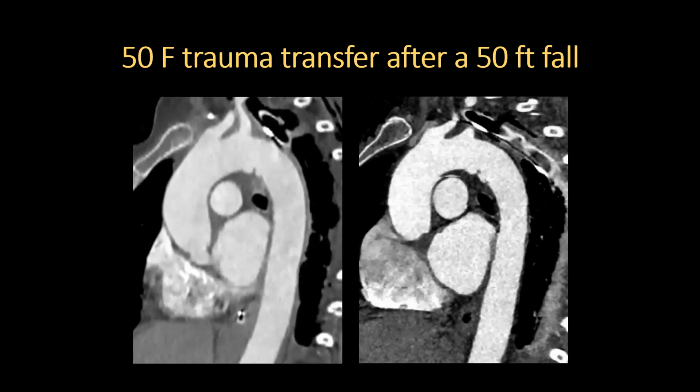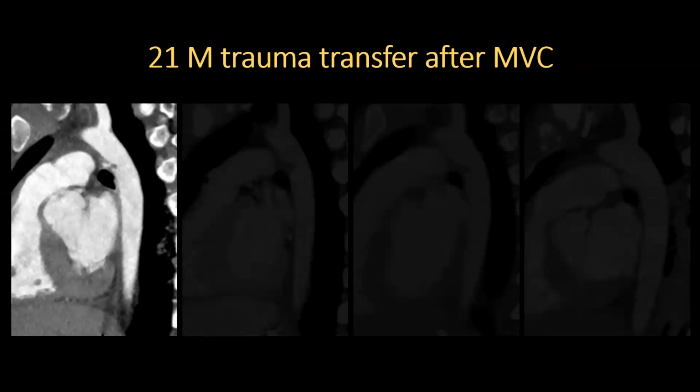The patient went on to get a follow-up CTA a few days later that showed the two bulges persisted and slightly increased in size. She went on to endovascular repair. The guidelines do not distinguish between small and large pseudoaneurysm treatment recommendations, although an emerging concept is that some small pseudoaneurysms might be amenable to non-operative management.